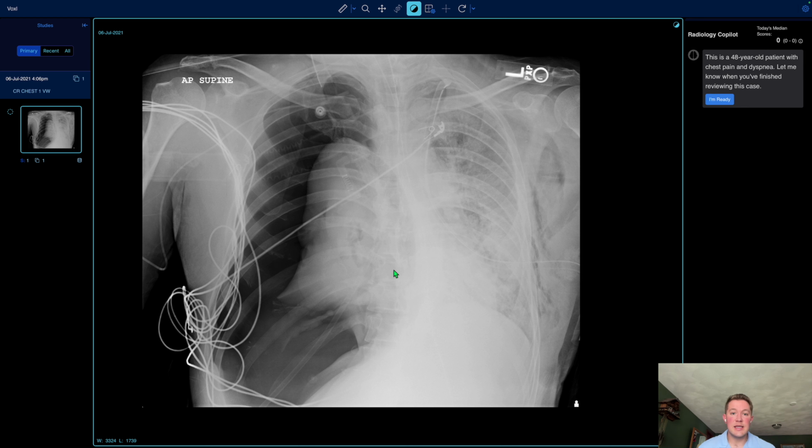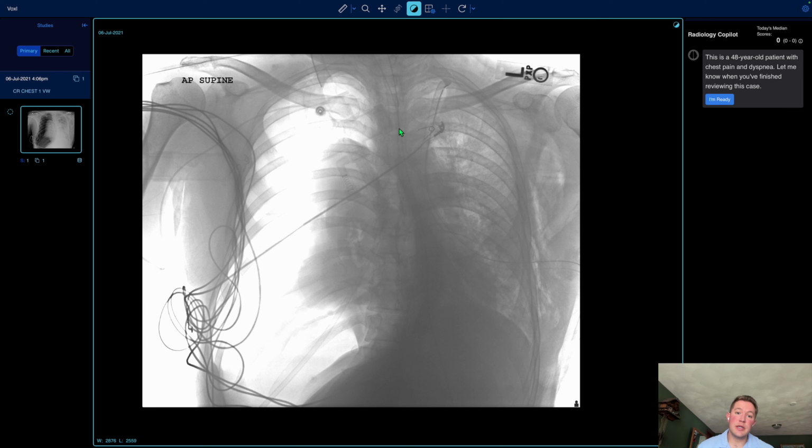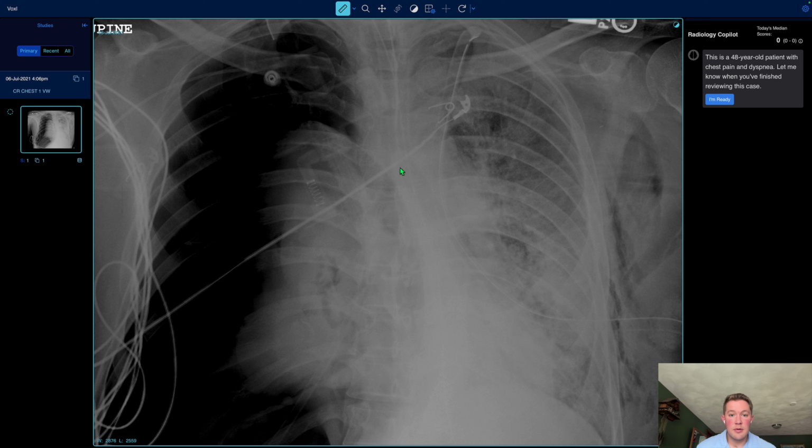So we have an ETT tube that's placed into the larynx, and its tip, if we were to measure it out down to the carina, is right around 2.6. Yeah, it's difficult to visualize. That's right. Okay.